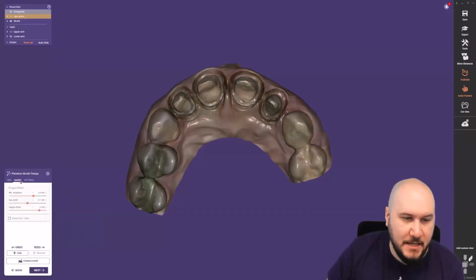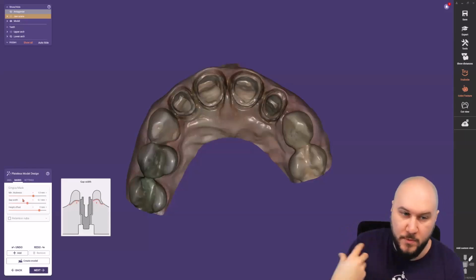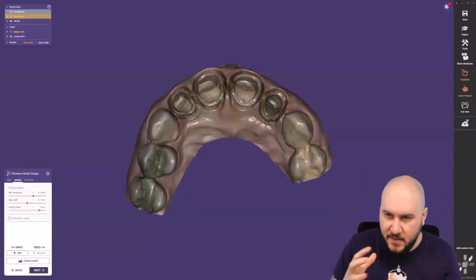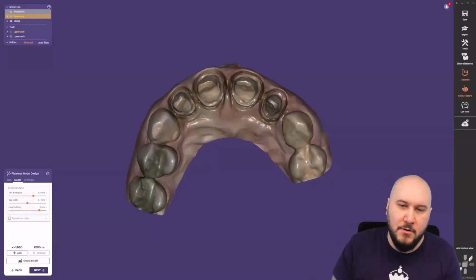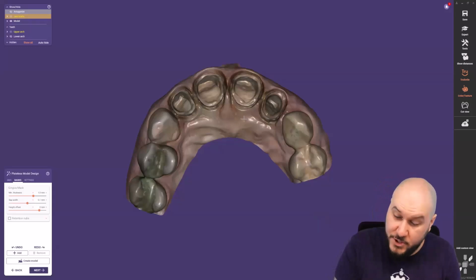We talk about masks. We can also now toggle different kinds of gingiva masks here. In this type, I have chosen Plateless model with cutout dies. I can, for example, make my individual gingiva mask here. I don't have the flat positioning to the gingiva. Sometimes we also had that as a support request, so I will mention that real quick. People are asking, I want to use my gingiva mask, but I just get it individual on the model, and I don't have the option to set the gingiva mask flat.